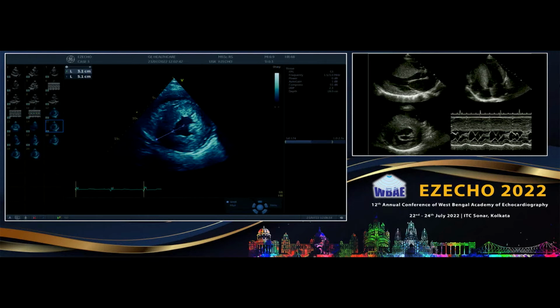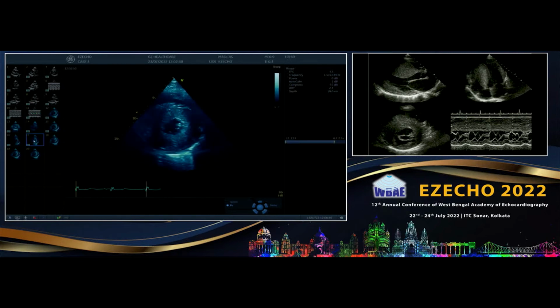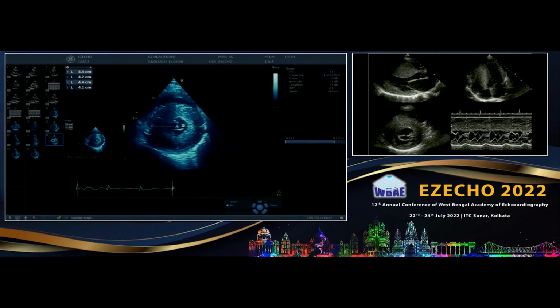Yeah, but the 5 is too high. Too high. See, that means someone's 25 is already 30. That is very bad. So let us at least measure that way. Let us look at it that way.